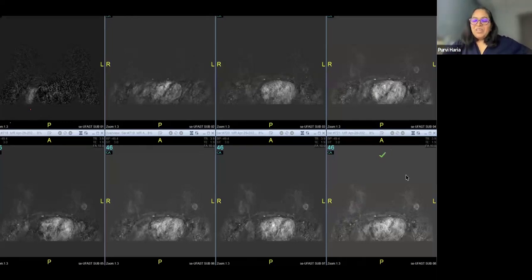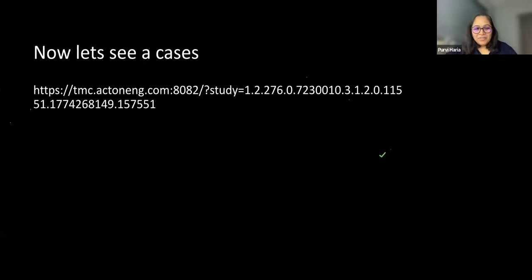So many times when we ask for an MR, like when you're doing a BCT, we want to see that there is nothing else which is enhancing, and this is the safest place where we don't have any doubt for any other lesions which need a histopathology again. So I have some kind of case.